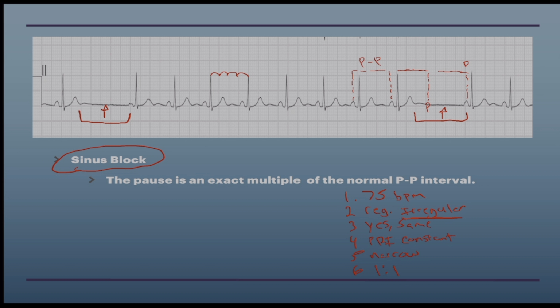And what's happening in a sinus block here is that the SA node is just simply unaware that the impulse was blocked before it continued to fire throughout the conduction system. So the SA node just fires again in its normal time on the next beat, and we see that beat pop up here. So the SA node fires here, it goes to fire here, but nothing happens. It just doesn't realize that nothing happened. So then it just fires again on its next beat on down the line.